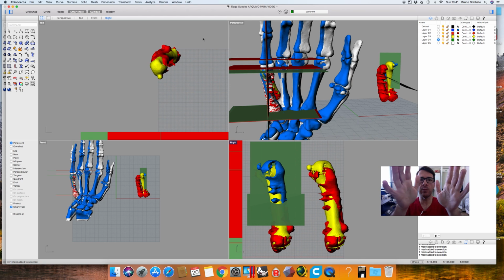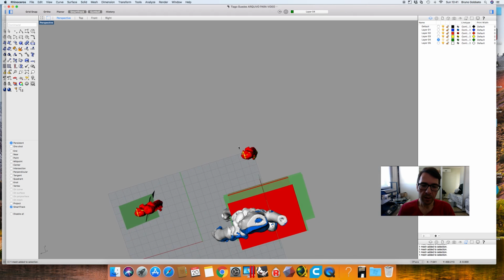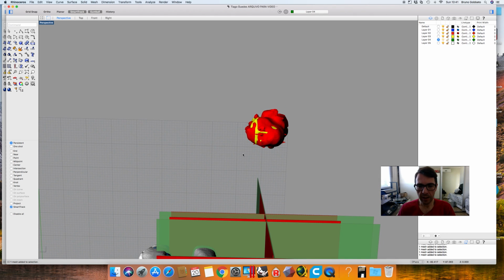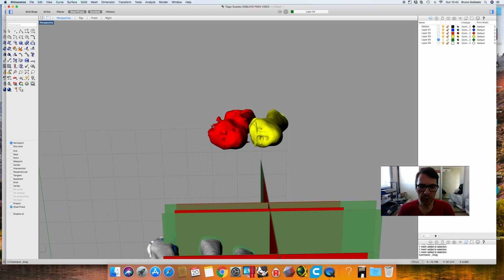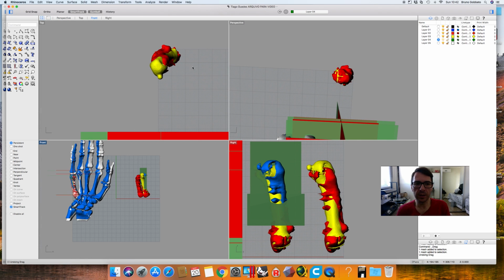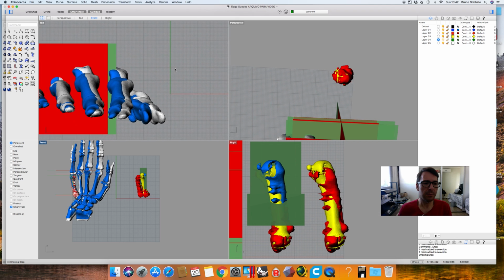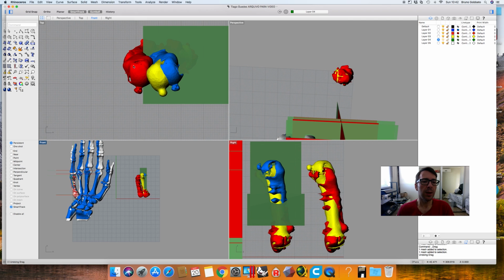So we have tried our best in order to align the base of the metacarpal principally in height, but in rotation, okay? This was not a very easy task, okay? But we think we could do a good job. As you can see here, I'm going to move a little bit in order to understand that the rotation is almost aligned, both metacarpals. Okay, let's go back. And for the purpose of this video, we have already done some measurements. So here, what we did.